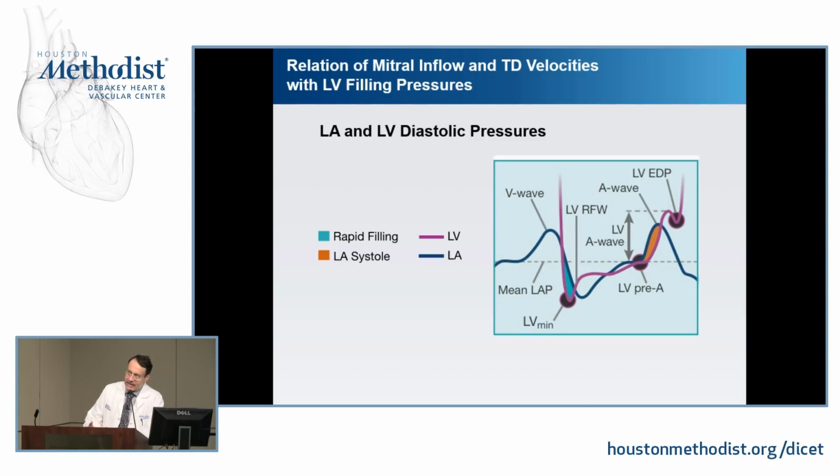In the course of diastolic dysfunction and in the development of this disease, the earliest pressure to be abnormal is EDP. Later on, the situation gets worse in terms of, say, worse myocardial disease. The intravascular volume expands. Another diastolic pressure is the pre-A pressure. The pressure in the ventricle just before the atrium contracts rises as well.